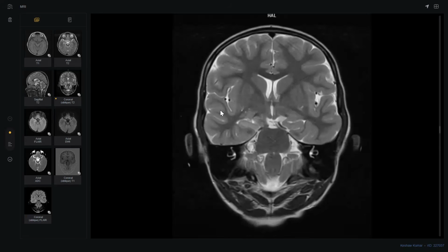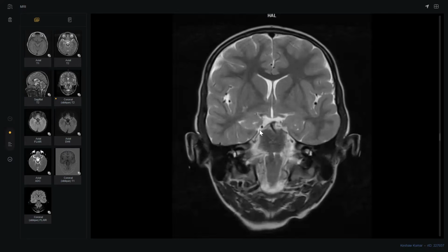And what else is the last criterion of typical mesial temporal sclerosis? I should be looking at the GRE sequence for any blooming artifact. If you look here, you will see some undulation, but here it is smooth, completely smooth, correct? Yes, sir.